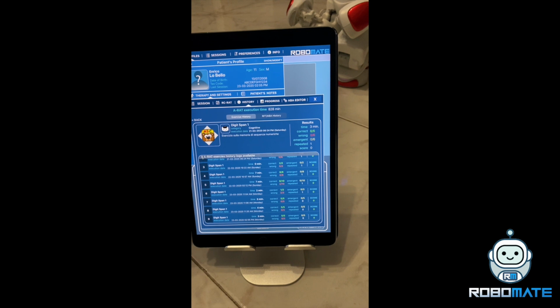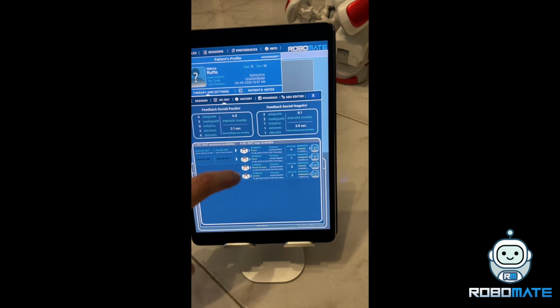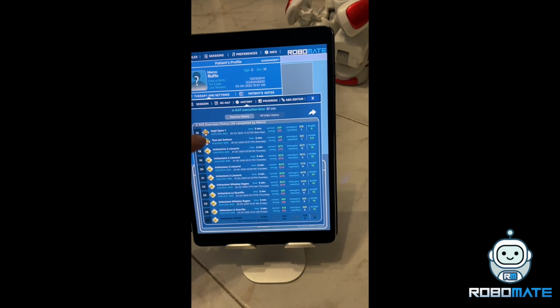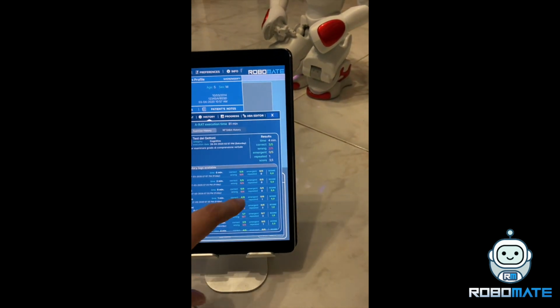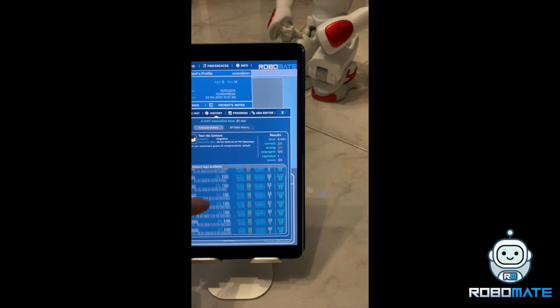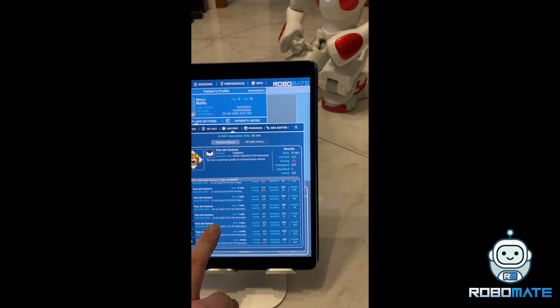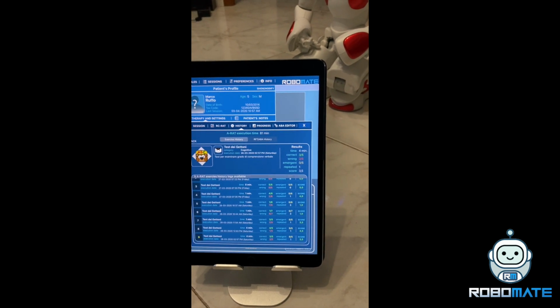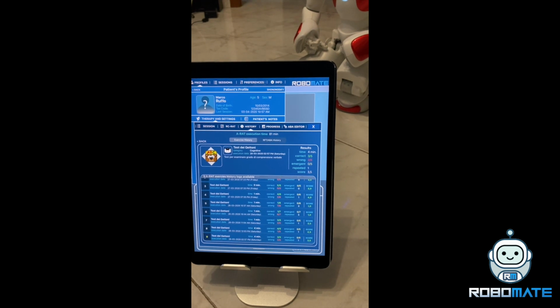I will show you one with imported data like this. We have, for example, all the scores about this exercise and the date of the exercise and the correct or wrong, emergent and repeated interaction that the patient gives to the robot.